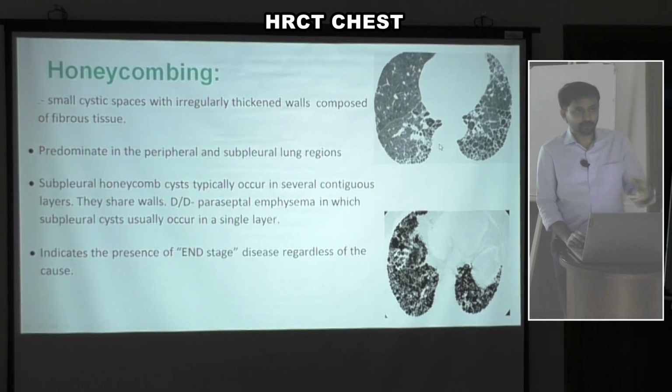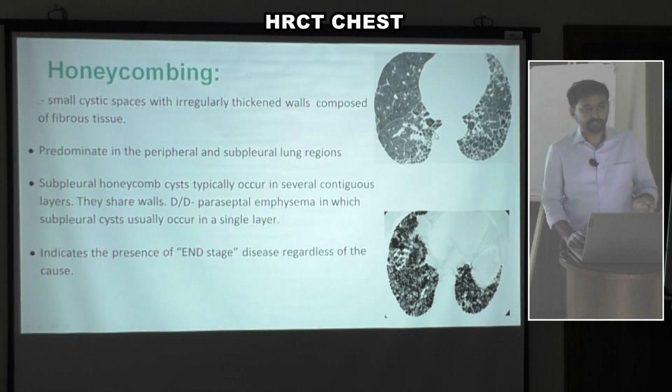That means that part of the lung is gone. Functional lung is gone, especially if you see honeycombing, and most commonly you see it in idiopathic pulmonary fibrosis, like interstitial lung disease.